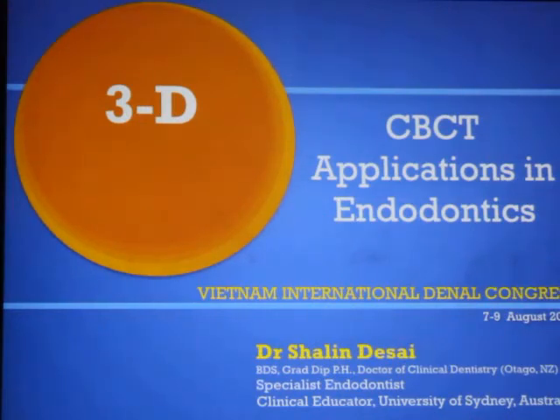Going to talk about cone beam CT applications in endodontics, and we'll go over lots of cases where I'll show the scans, and I'll tell you how it helps us to do a better diagnosis, better treatment, and overall better patient management.